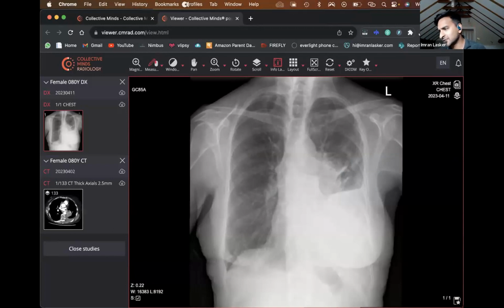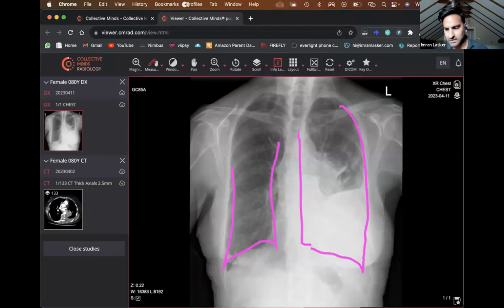So we've seen that this patient is very rotated at the moment, but I think the most glaring abnormality, hopefully everyone can agree, is that area over there. It doesn't look quite right. When you look at that lung over here, and then you look at the other area of the lung, you can see that this area doesn't look quite right. This all looks very whited out, right?